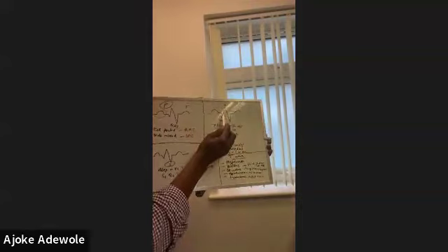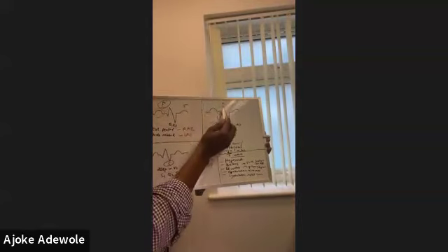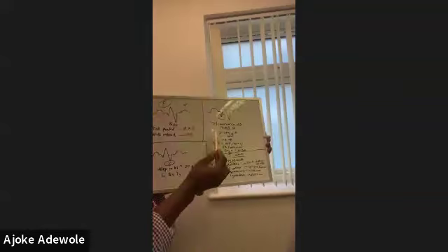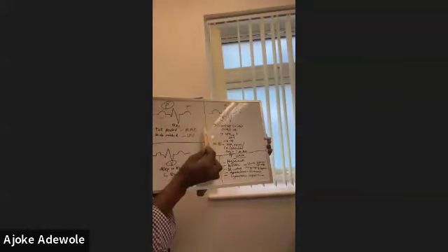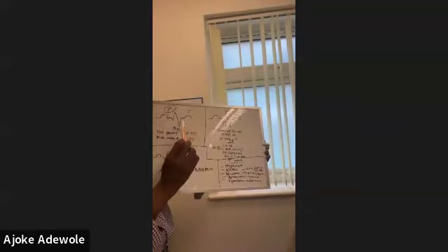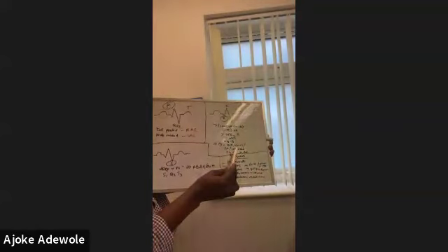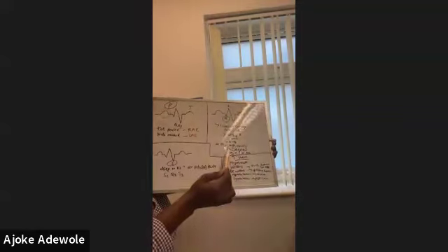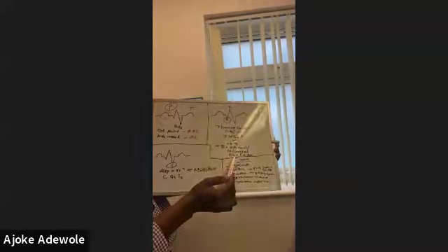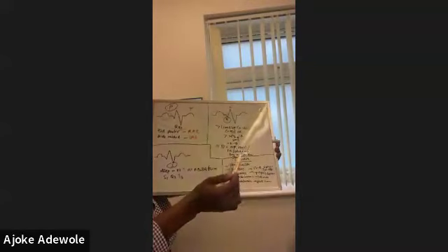So the Q wave depth should not be more than 1/4 of your R wave. And if that is happening, then what you have is a pathological Q wave. But note that this could be normal in aVR, III or V1. It could also be normal in early repolarization, and you could have an isolated and tiny Q wave in I or aVL.